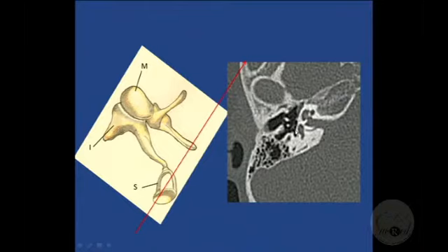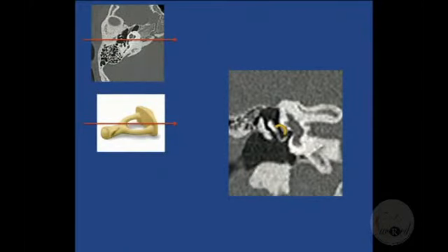findings, right? Okay, so I've already mentioned this to you, but this is a coronal image going through the stapes. The slice goes this way. I've already spoken to you about the incudostapedial angle, 90 degrees, and it should be 90 or less. If it is obtuse, the fulcrum is not adequate. It's not able to push in all the sound waves. It's not able to amplify the sound impulses. So you need to have that 90-degree curve.